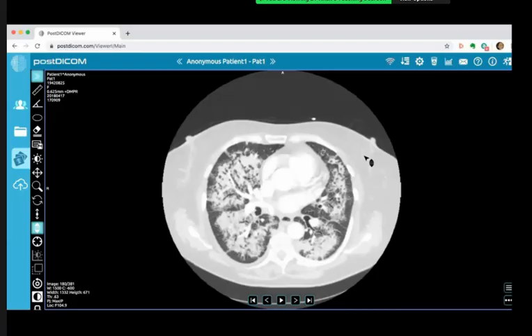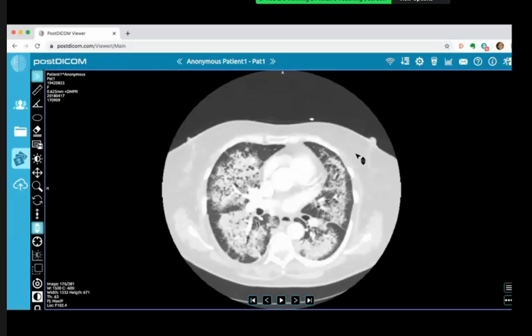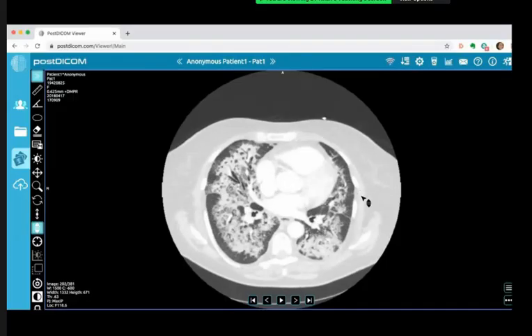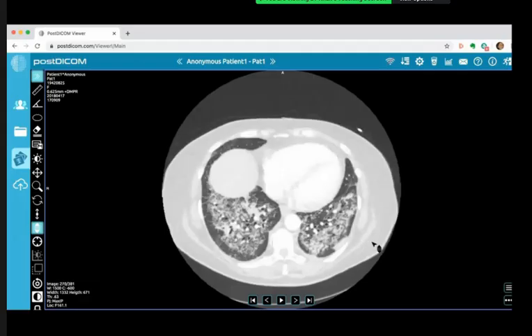Pulmonary alveolar proteinosis can sometimes give this appearance as well. It can spare the subpleural spaces. Usually it's diffusely homogeneous. I'm just wondering, pulmonary edema can, but again, it's quite atypical of pulmonary edema. And there are no effusions. Yeah, there's no effusion, and the heart size is normal for an elderly lady. It looks like a more consolidative picture to me.